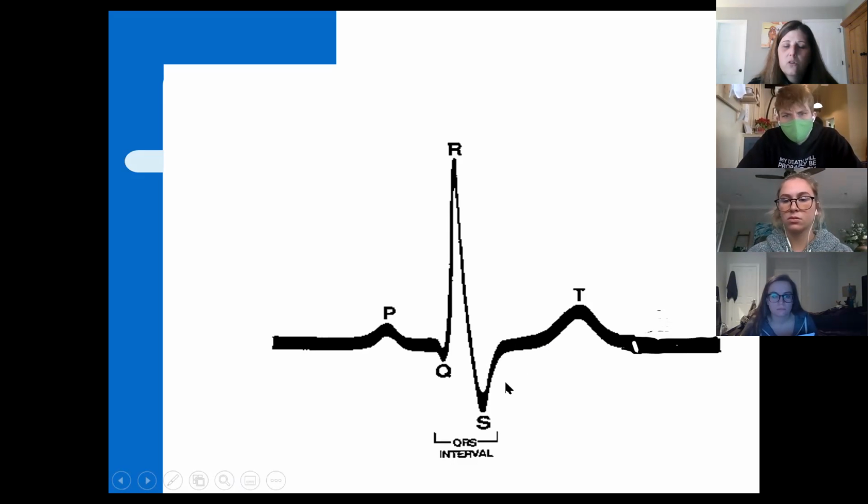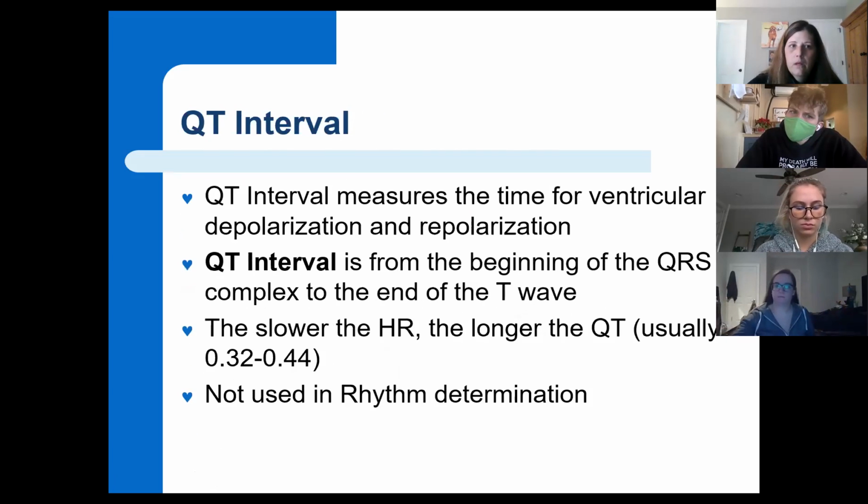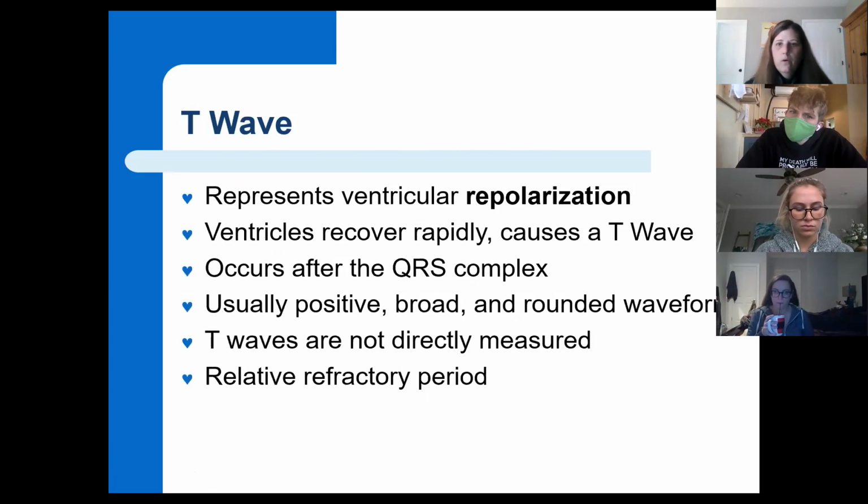Don't start thinking it's clear down here. That's still part of the S wave. It hasn't gotten back up to that isoelectric line yet. Does that help? Okay.